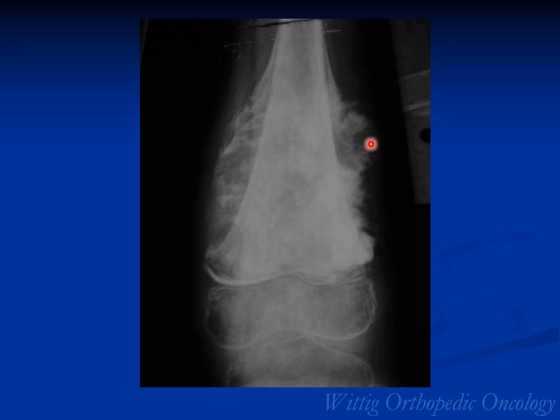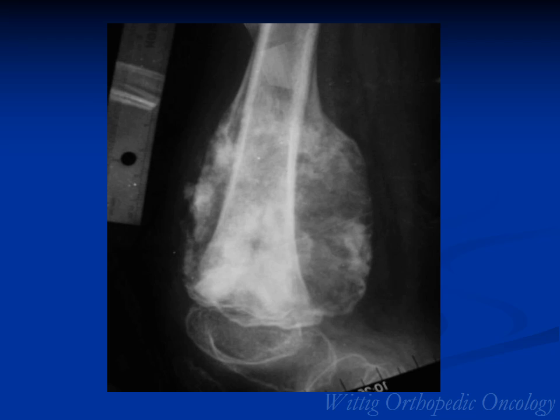It's another example of an osteosarcoma of the distal femur. You can see here a permeative lesion which is producing bone, this fluffy cloud-like substance in the soft tissues and in the medullary canal, and it's elevated the periosteum at the periphery, producing Codman triangles. This is a lateral of that osteosarcoma, and again, notice the fluffy cloud-like density in the soft tissue component of the tumor.